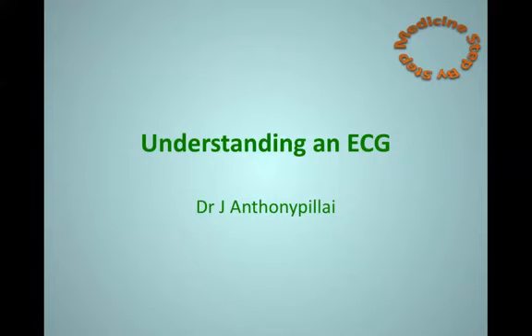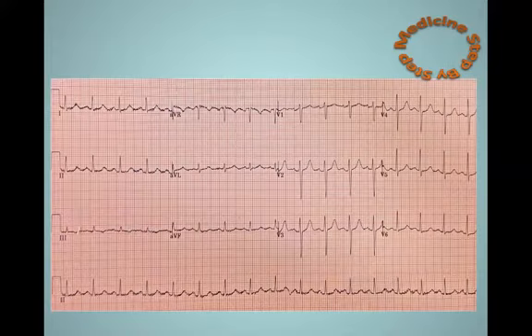Hello everyone. Today I'm going to explain very simply what you're looking at when you see an ECG. When a standard 12-lead ECG tracing gets put in front of you, this is what you will typically see. If you're not familiar with ECGs, then this can look very daunting, so let's break it down.